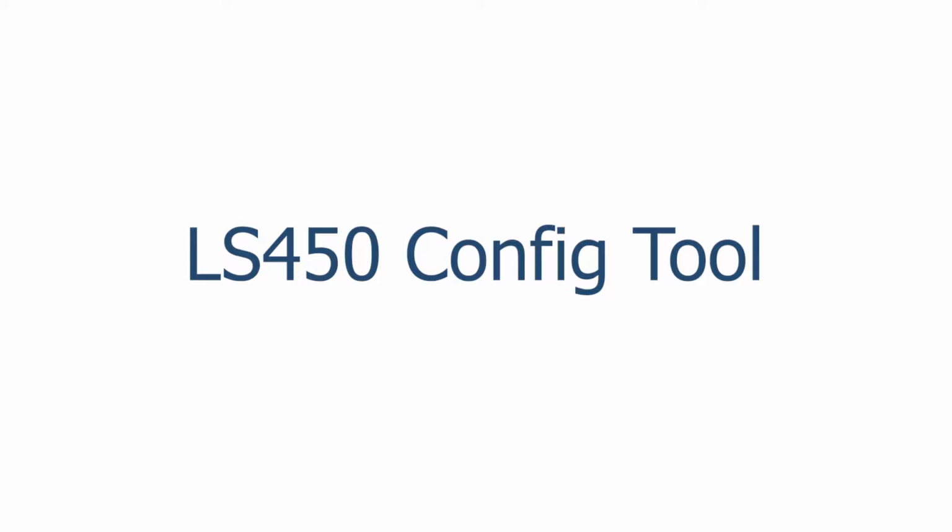In this video, we will cover use of the LS450 config tool. We will first be configuring as a new installation, and later in the video, we will be covering how to add to an existing configuration.